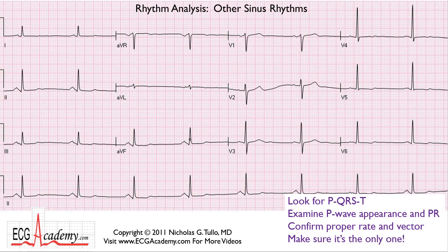And this one looks a little bit like the first ECG. If you'd rather look at the heart rate first, that's completely up to you. The first thing you should look at is regularity. Look at the forest, and these beats seem to be fairly equally spaced. And the heart rate is slow.